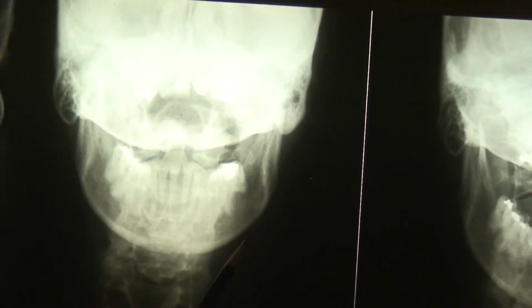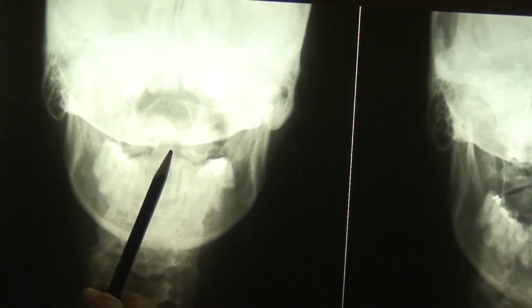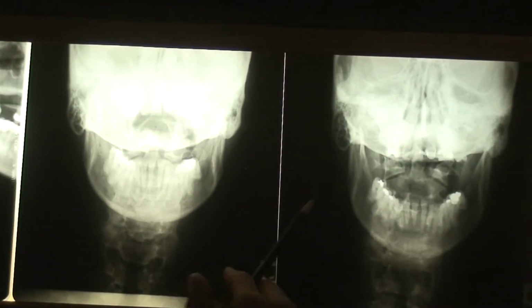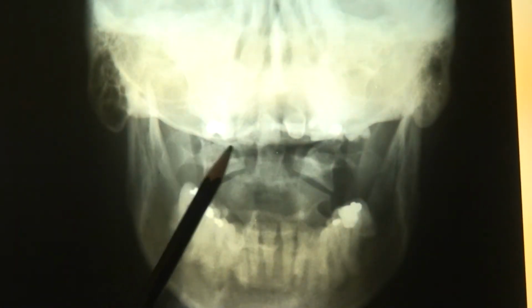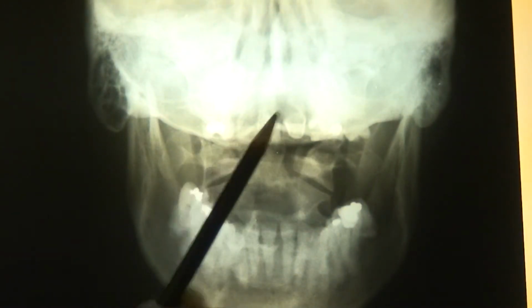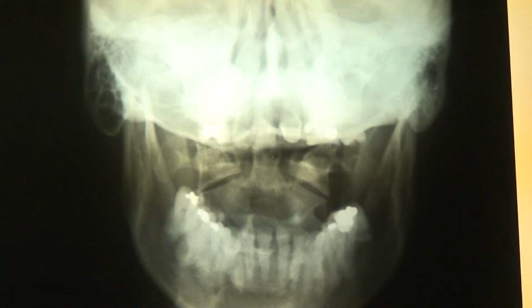The problem with this is if the teeth are higher than the lateral mass, it creates rotation and creates different positions of the foramen magnum, and you will not get a correct, accurate picture of what you're looking at. Let's take a look, for instance, at this picture. On this picture, you see where the teeth strike the top third of the atlas lateral mass right there. That's an excellent position. Also look at where the eye orbits are. Everything's intact. You can see this is a good positional picture.